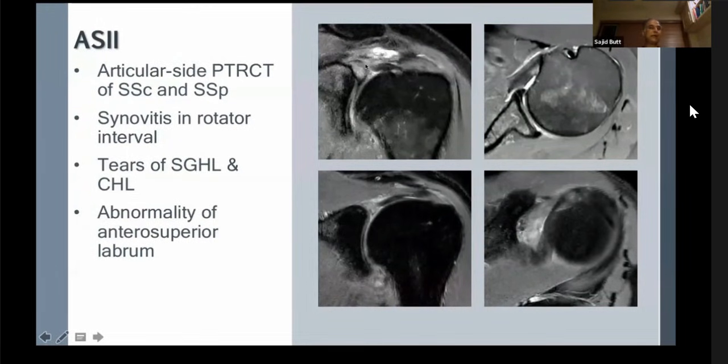So you could ask me that why can this not be adhesive capsulitis? Because these are exactly the signs I showed you with adhesive capsulitis, right? Why? Because it's a different history. It's not a 45-year-old woman presenting with limited movement of the shoulder with a history of around 6 months or so. This is a 22-year-old javelin thrower who has been trying to compete at international level and now has got a pain at a particular movement of the shoulder. So the history is really, really important. Just based on imaging, you cannot be right.